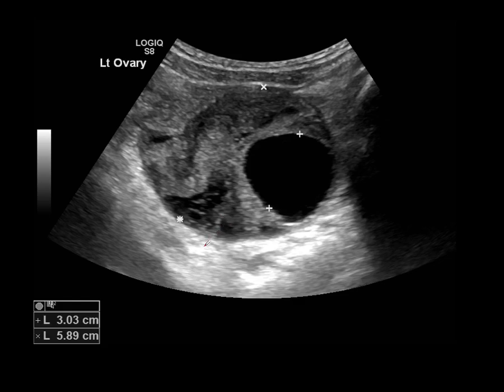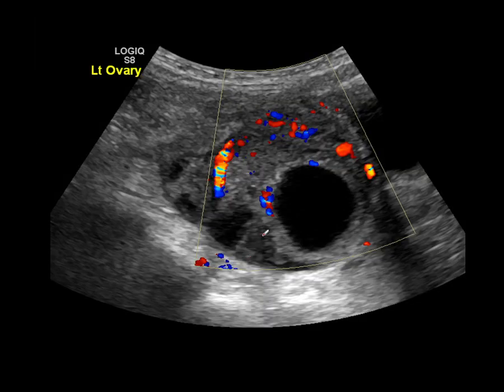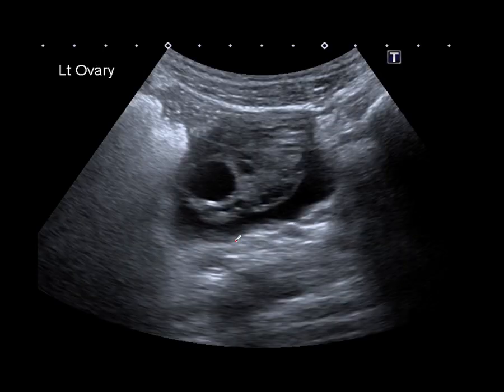Here's another hemorrhagic cyst. This one was identified as being greater than 5 centimeters, so straight away a follow-up will be needed. Very irregular internal appearance. It's quite a complex vascular pattern. I don't know what was going on here, whether there were two hemorrhagic cysts together, but clearly a rescan is required. There is, however, a relatively smooth border. In this portion, we obviously can't evaluate the border of this part here on this particular image, but we followed the patient up and it returned to normal. So it was just a hemorrhagic cyst.